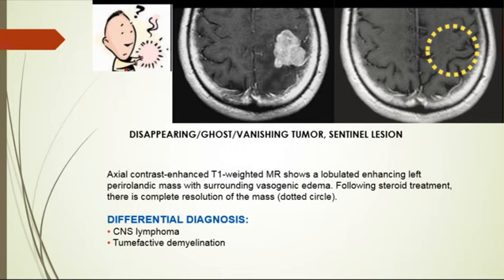Primary central nervous system lymphoma occurs in immunocompromised patients and in immunocompetent individuals after the 5th decade. The most common is the non-Hodgkin B cell type. Due to tumor hypercellularity, lesions are typically hyperdense on the CT scan and hypointense on T2, due to hypercellularity. In general, it is iso to hypointense on T2 MRI and hyperdense on CT because of densely packed cells.